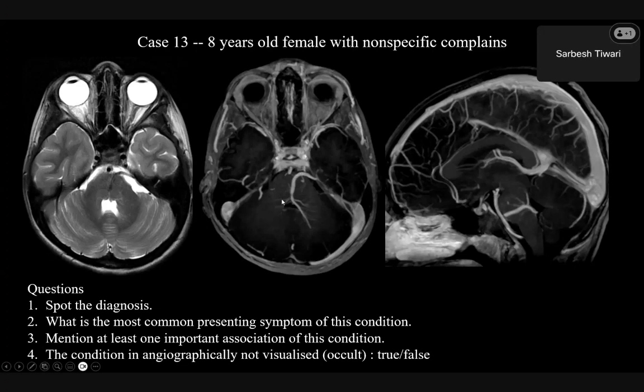In case of DTI, you have a universal color coding. The superior-inferior directed fibers are blue in color. Like corticospinal tracts, yes, projection fibers, they come from top to down, so these will be colored blue. The interhemispheric fibers, the crossing fibers, will be colored red, and the fibers connecting the same hemisphere will be colored green.